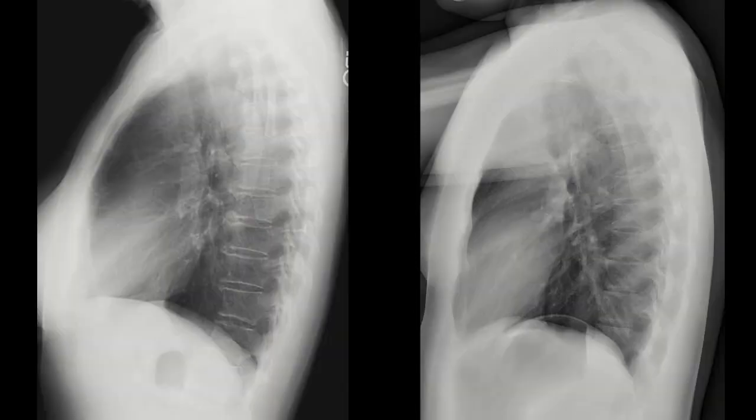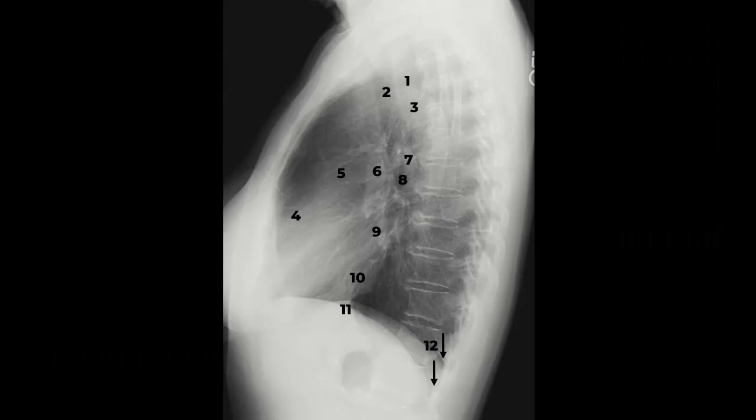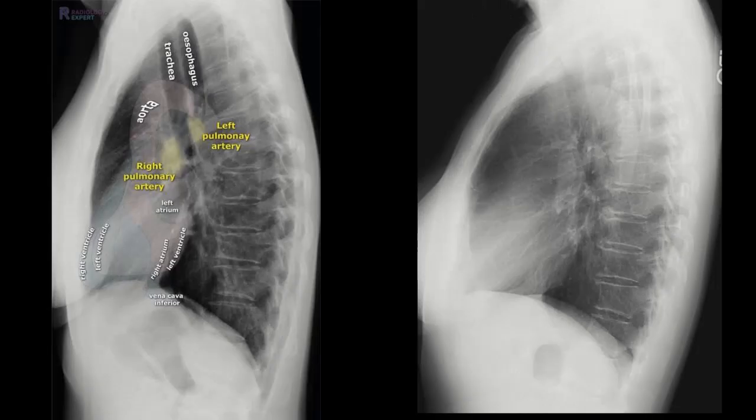On the left is the same image just seen, but on the right is a patient that has had her arms extended forward. Notice how this arm position obscures the superior mediastinum. The features indicated are structures that we will go through and identify. Look at the lateral X-ray to see the features in the annotated image. Notice the airspace behind the sternum and the heart.